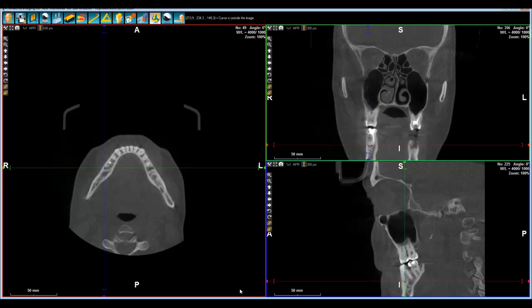There is a nice feature on WhiteFox imaging in case you're working with referring doctors. If a doctor sends you a patient for a cone beam scan, you have different ways that you can communicate to your referring doctor. One of the easiest is to make a report, and it's also a commonly accepted one, especially if you have a good printer. So how do we do a report?